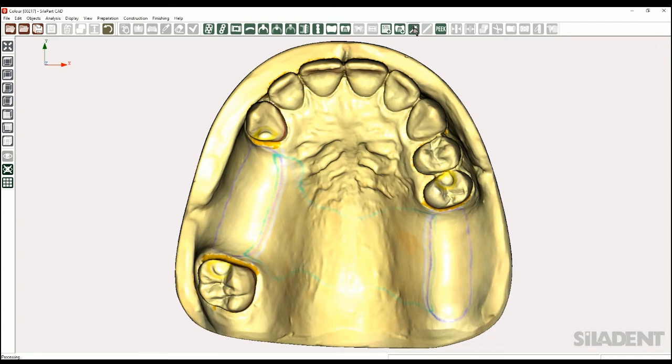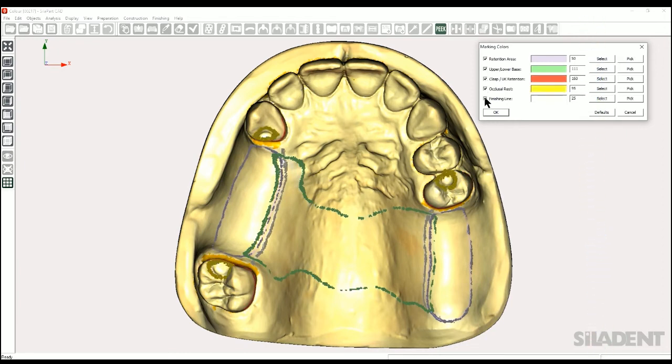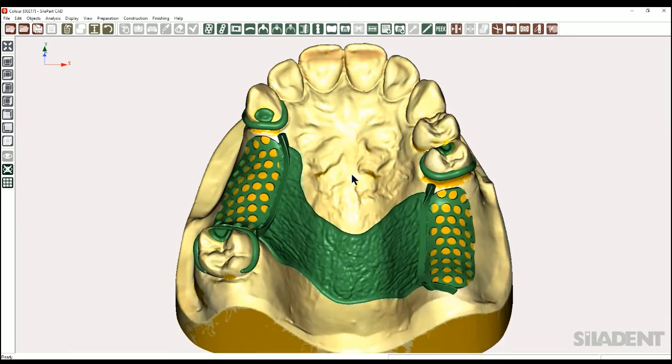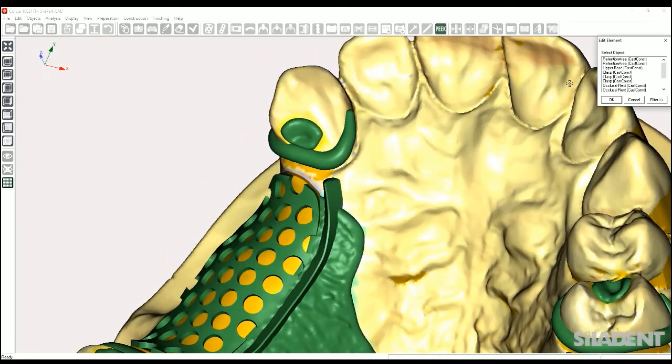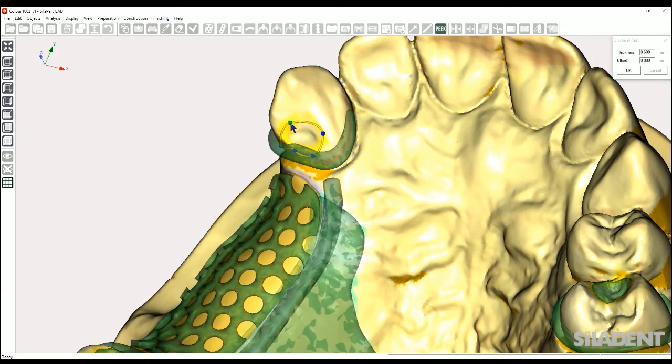For the automatic design, up to 5 colors are available. If all colors have been fixed, you can use the wizard function again, and the software suggests a complete design project. In the next step, it is only necessary to edit the elements and bring them into their final position.